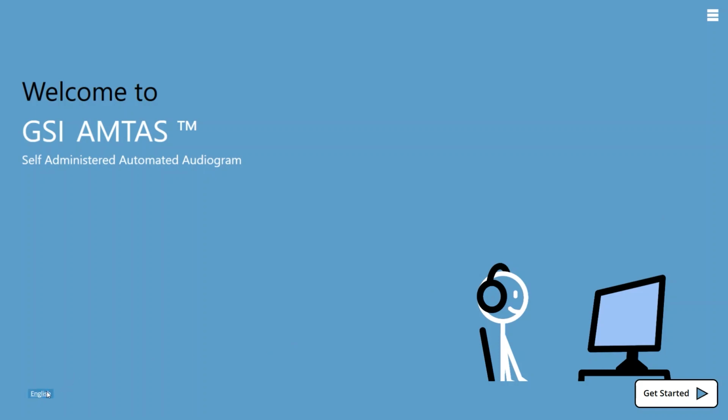The other thing I wanted to point out about this particular screen is down here on the lower left, this is where my languages are. If I wanted to select a different language for this particular test, I would select that, and you can see that now my options have turned into a language other than English. Then I would just go ahead and start the test, and when the test completed and I started the next test, everything would go back to the defaults that were set up in my configuration application. So that is the general rundown of how we are doing our configuration for AMTAS Pro.